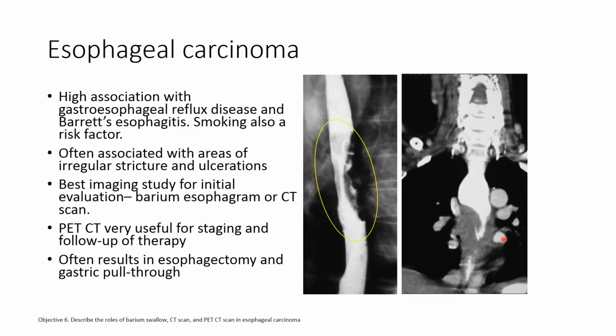Now, this patient has a very advanced esophageal carcinoma, and so we see not only the mass, which is this gray, around the white. The white is the lumen that has contrast in it, but we also see an ulceration into the mass, and that's fairly common with these esophageal carcinomas. Dr. Loy discusses esophageal carcinomas on slides 23 through 32 of his lecture, and you can refer to those for other risk factors, etc.